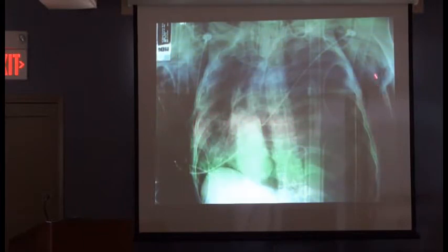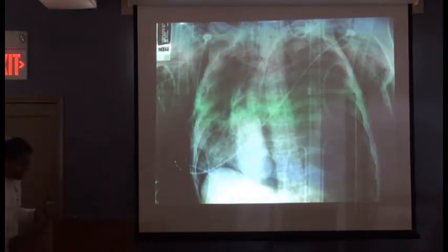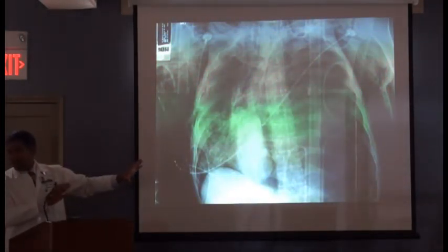That's called subcutaneous emphysema, and that's crepitance that you're going to feel clinically. And obviously you can see, because this heart is so pushed off to the side there, that the patient's going to get hemodynamic collapse. Now, in theory, we never want to have a chest X-ray like this. So we should recognize this before this happens.